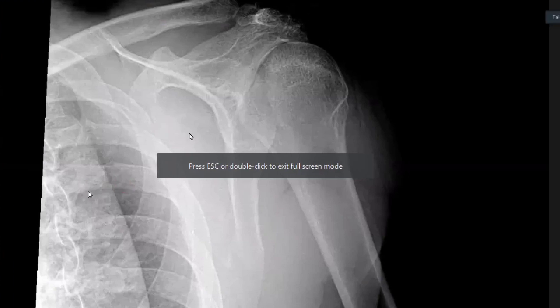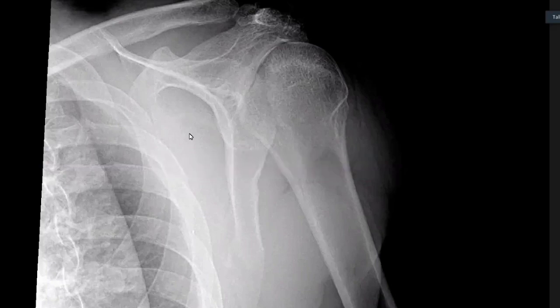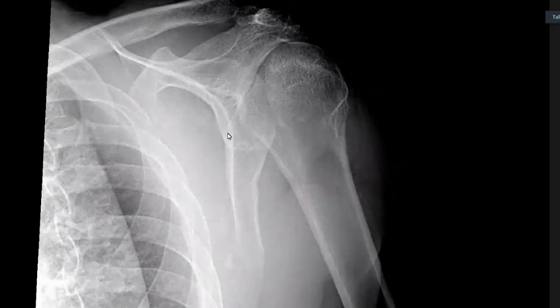I think what I can appreciate now is that it seems to me dislocated posteriorly. Apart from that, the acromioclavicular joint is normal. What about the humeral head? The inferior margin of the glenoid is a bit irregular. I mean, you'll be more interested in the inferior margin if the humerus is sitting under the coracoid, isn't it? I think this is fine, but you will assess it more if it's an anterior dislocation, right? Yes, definitely. But this is a posterior dislocation, right?